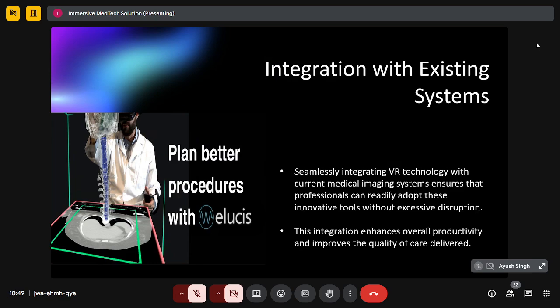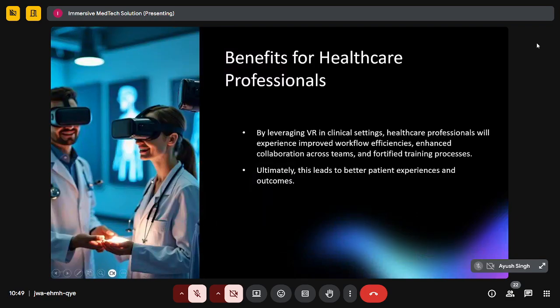of the data set, and we can further work and enhance whatever image data set we are working on. This integration also allows us to further enhance the efficiency and improve the quality of whatever product we are delivering. We can directly interact with the set over here, as you can see. We can go to specific points of modulation and correct out the smallest of the defect. We can also remove the region that is not required. So we have the accuracy at the highest level.